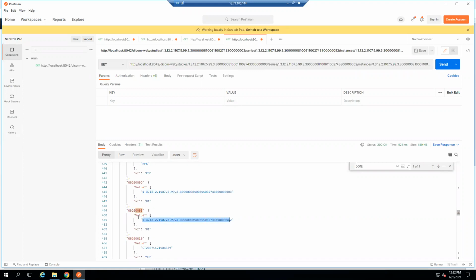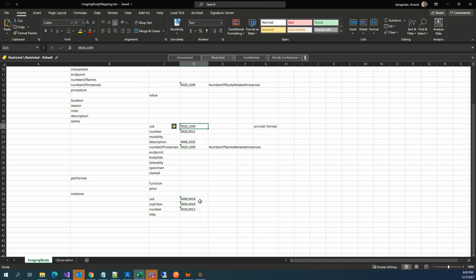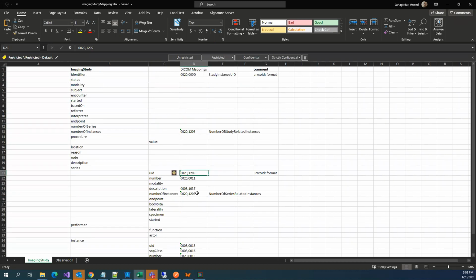That is what we'll be doing tomorrow. So that's about this mapping. You should only need to know the tags from where you get the values. You will expand this tag into a JSON path explicitly, so that it is easier. I'll share this initial mapping that was created, and also the observation mapping which I just started.